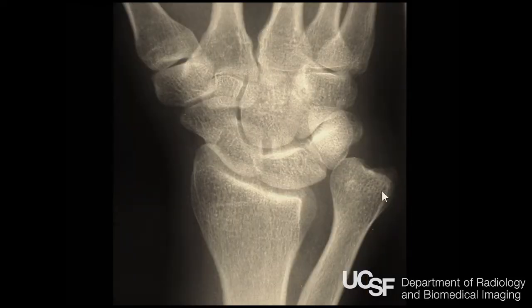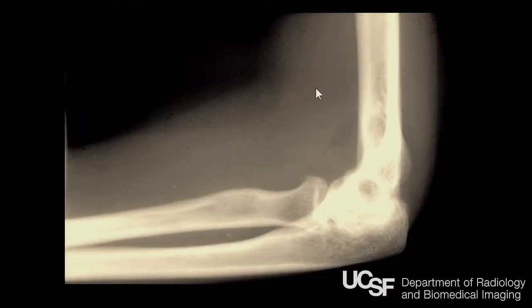Here is what it looks like on an AP radiograph. The ulna is dislocated. Like I said, all you need is one fat pad. Here is a patient with the sail sign. This fat right here should actually have a contour that goes like this and go all the way to the bone. Instead, this edge got lifted up from a hemorrhage, pushed up out of this coronoid fossa.